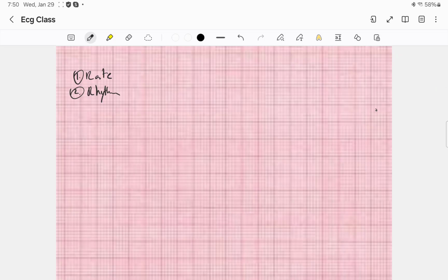And not only that, but also that the patient has a normal heart rate. So for example, someone whose pacemaker is the sinus node, but their heart rate is fast, this would be a sinus tachycardia, right? Not normal sinus rhythm.